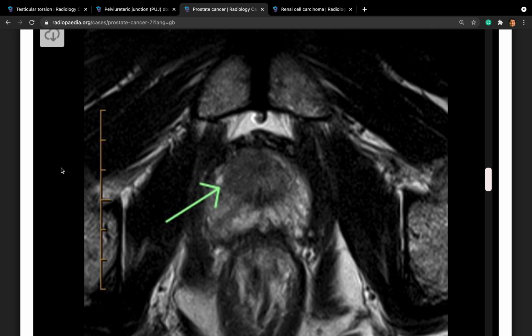After that, there is dynamic contrast enhancement after giving the gadolinium contrast. The prostate cancer cells have newly formed blood vessels by angiogenesis, and they're quite immature, so they pick up the contrast and release it quite quickly, and that's defined as a rapid wash in, wash out. Usually the prostate cancer area appears white on that phase. Then the last one would be the ADC, the apparent diffusion coefficient. It's a calculated value using the DWI phase, and prostate cancer appears dark on that phase.